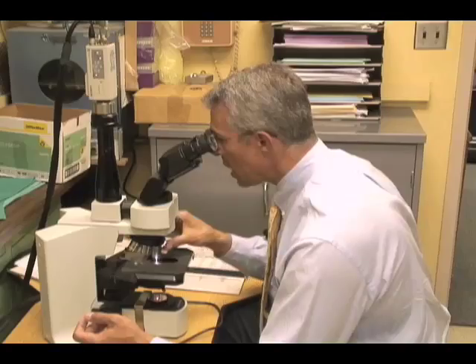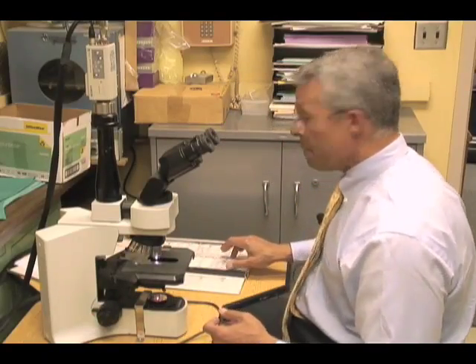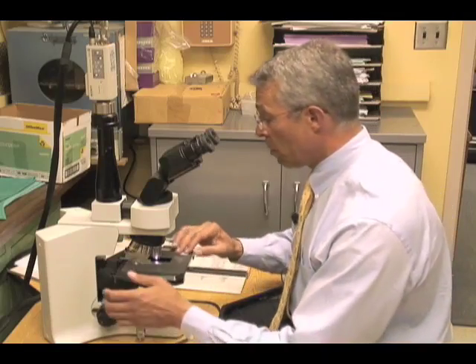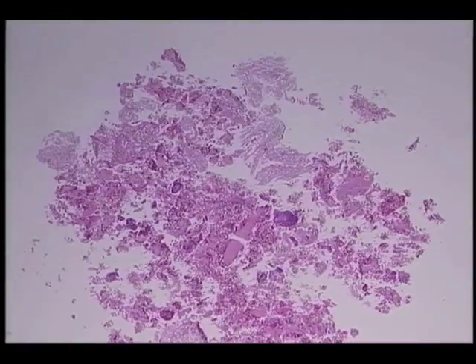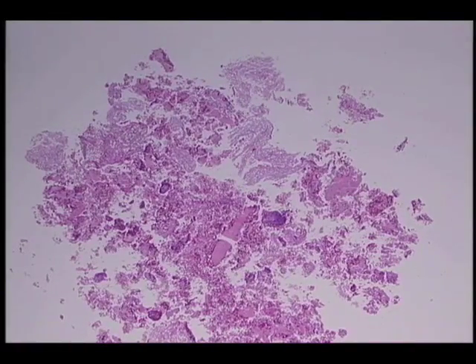To conclude this small segment, we'll show you a biopsy that's not quite as abundant, just so that you can see that sometimes examining SpiraBrush samples can be a little bit tricky, as can be examining any sample such as an ECC or a small cervical biopsy. And here's a SpiraBrush sample that fits into a low power field.